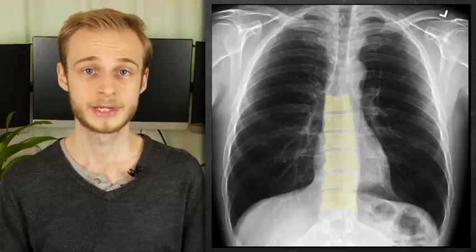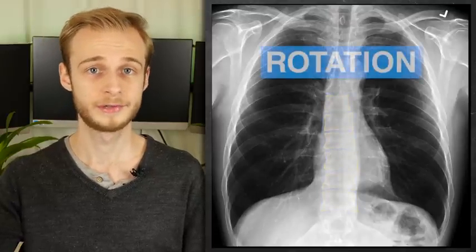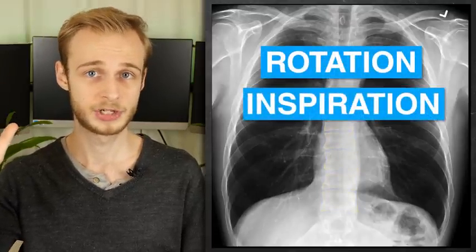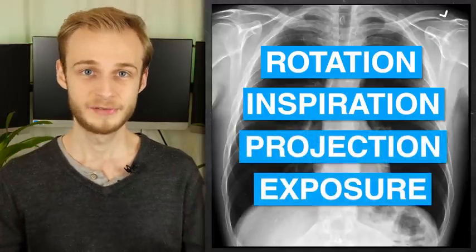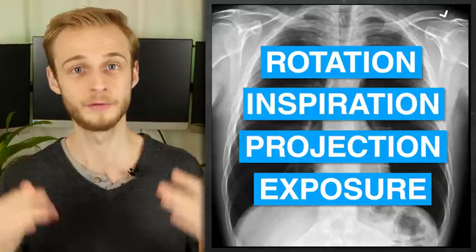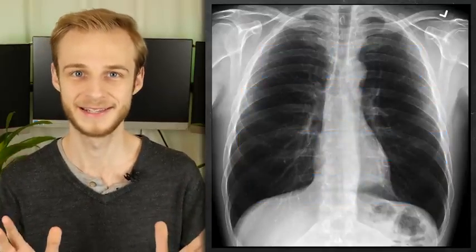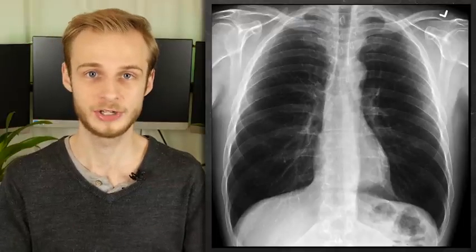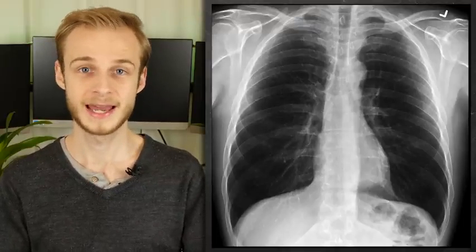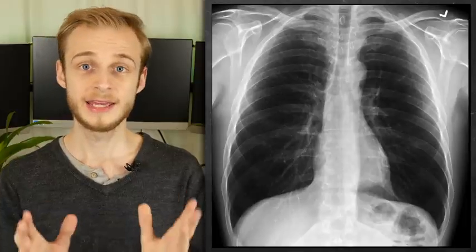So running through our process quickly one more time, we have R for rotation, I for inspiration, P for projection and E for exposure. So look at how much information there is to assess even before we've gotten on to any clinical findings. So now that we've assessed the quality of the image, it's time to actually think about our patient, and the approach we use for this is A, B, C, D, E. Now A is for airway.